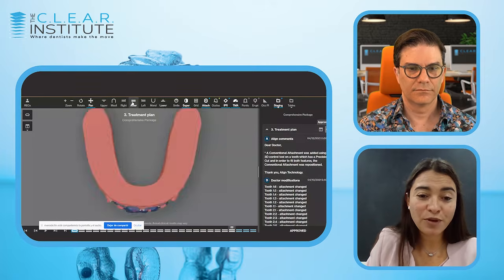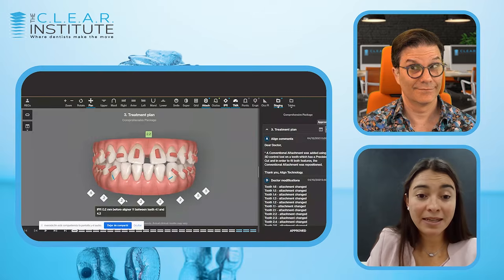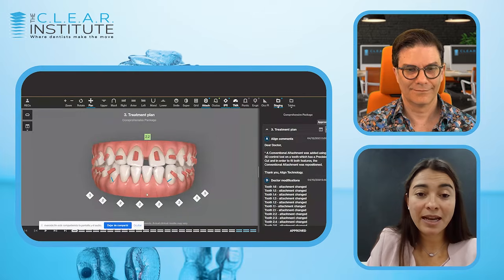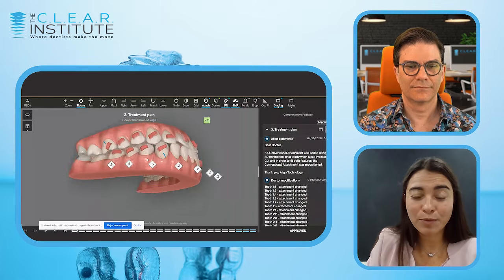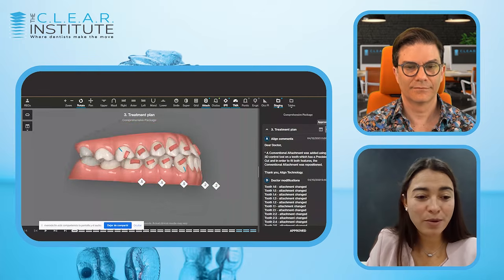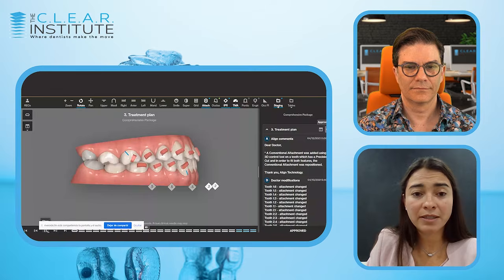Why do we want to overcorrect the edge-to-edge occlusion? Because it's a class 3, and class 3 mandibles always keep going forward. So if you have a skeletal class 3 component, you always want to overcorrect.